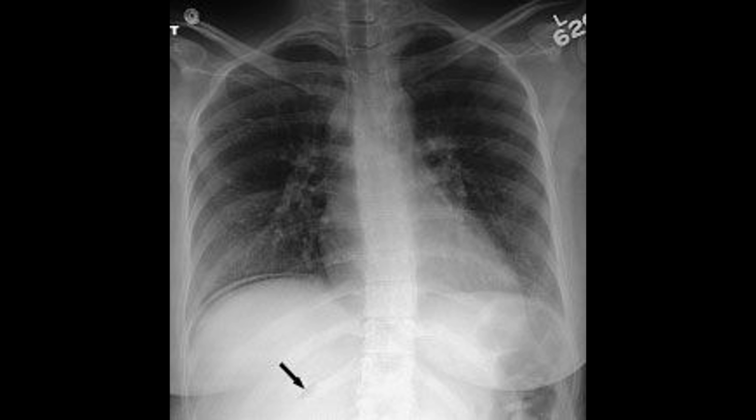If there is any diagnostic uncertainty, additional views can help. An upright or left lateral decubitus radiograph is particularly useful, as free intraperitoneal gas will rise and outline the inferior surface of the diaphragm, while pneumothorax air will collect apically or along the lateral chest wall. It is also important to be aware of mimics of free peritoneal gas, such as colonic interposition, Chilaiditi sign, in which haustral markings are visible beneath the diaphragm, helping to differentiate it from true free gas.